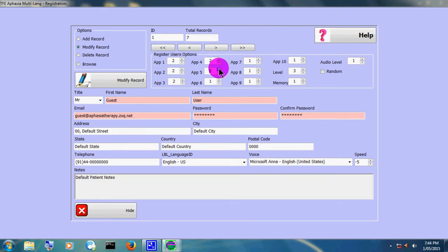Now, as it is set in most of the applications, the first 10 records are the simplest. The next 10 records would be slightly more difficult, and so on and so forth. The most difficult would be the last 10 records. However, in some of the applications, the type of records are also changed quite a bit. So if you navigate through the records, you know what is being available for the particular number.